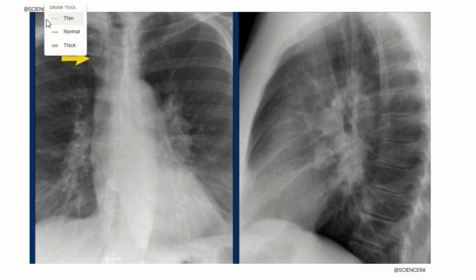Here is the clear diagram which indicates your hilar enlargement. You can see clearly here your hilar enlargement in the posterior anterior view, but it is not clear why it is dilated. Is it because of the dilated vessels or because of the enlarged lymph node? On the lateral view, there are round structures in the area where you don't expect any vessels.